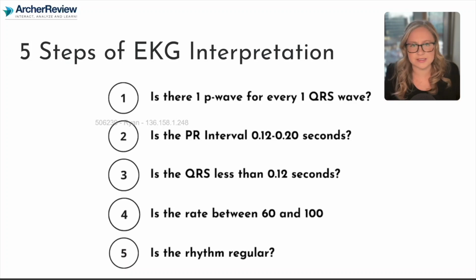So I actually like to think of it just in terms of those little boxes. I want it to be 3 to 5 little boxes. If that's how long the start of my P wave to my big R is, it's a normal PR interval. All right, step 3, we need to measure that QRS complex. And the words I want you to remember are tall and narrow. Tall and narrow are the normal attributes of a QRS complex. If they are wide, that's a problem.